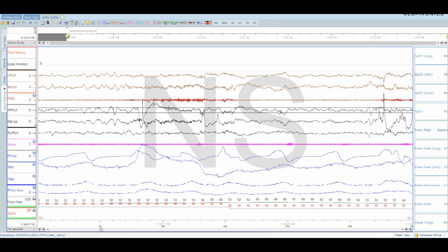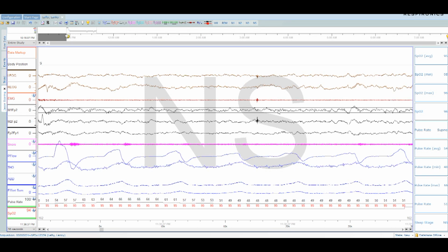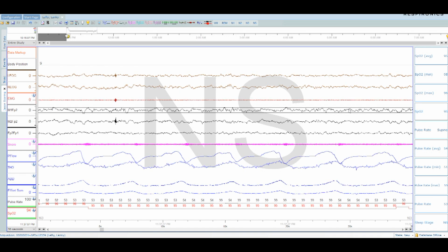That's how you do it, kids. Really freaking painful, but stage 1. Because we had another arousal, that's going to be stage 1 as well. But at the end, we have some sleep spindles. So we're going to call this 1, but with a little 2 at the end.